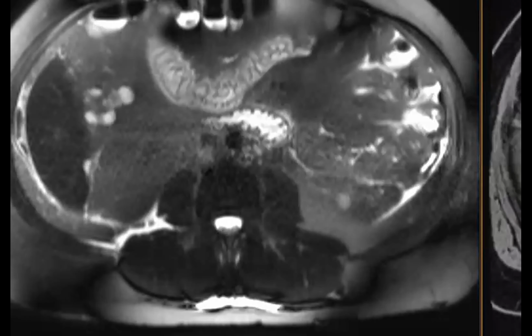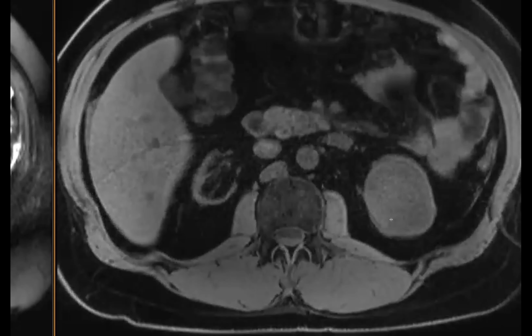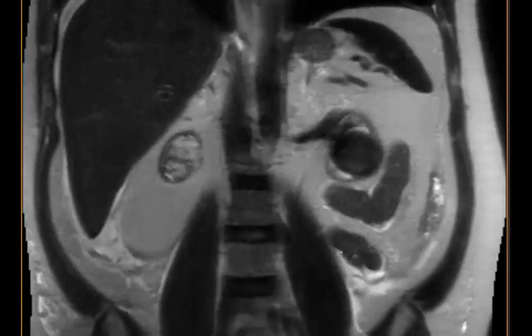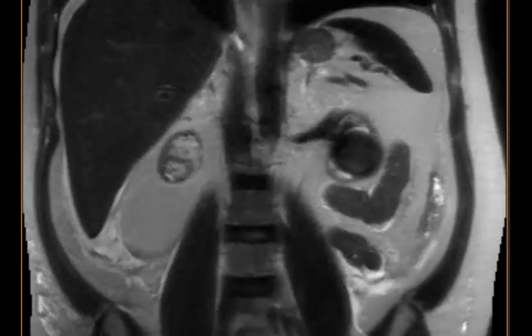Is it a fibroid? That's a great thought. It's like a dark thing. Exactly. This is the pre-contrast T1. I don't have a non-fat sat T2 on this study, but the subsequent study that was performed, I'm going to give you a non-fat sat T2 as well. That reminds me of a big fibroid, huge fibroid. So, you know, there wasn't contrast initially. You're absolutely on the right track, Aarti. And there was discussion of should we biopsy this thing. However, fortunately, we subsequently have contrast, and you know which way I'm going with this.